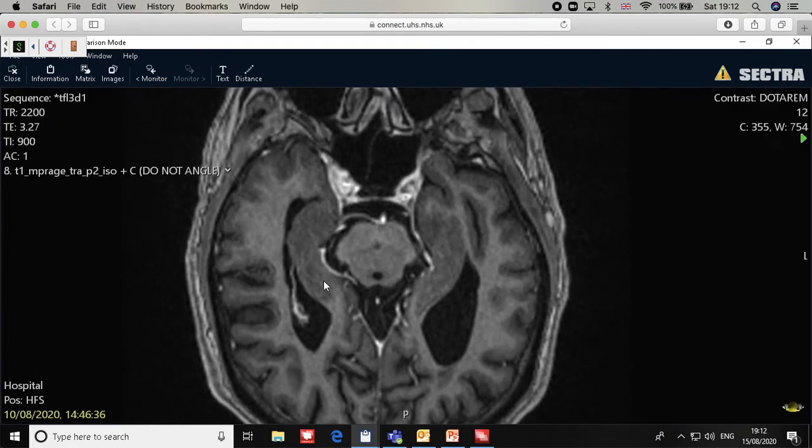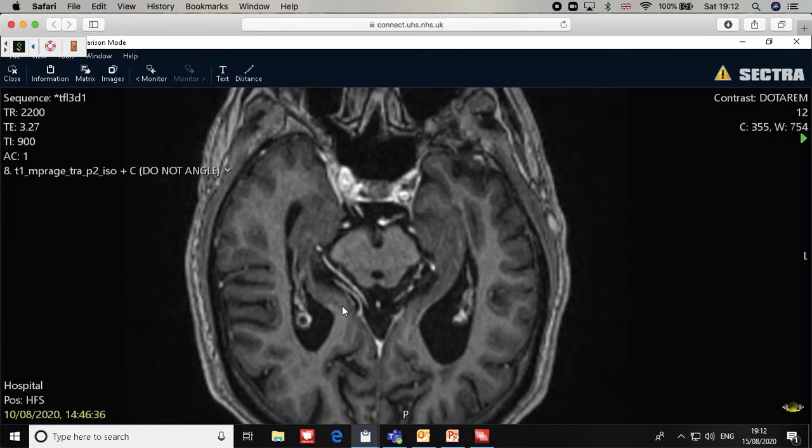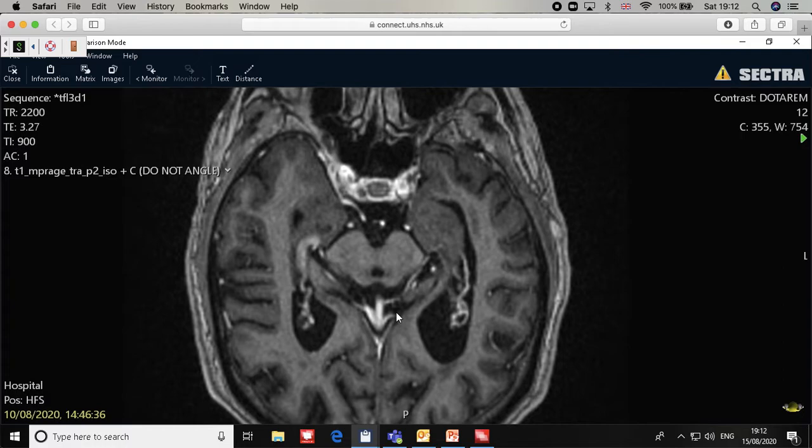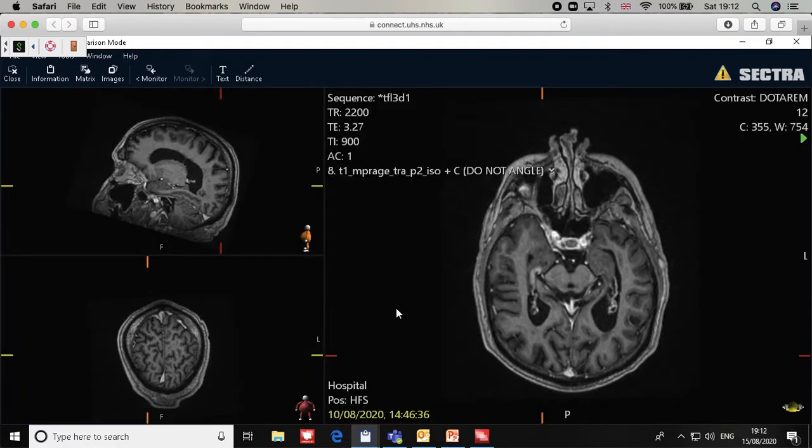I hope this is not difficult. You can see it here. This is the tail. I don't know why it's so slow like that. Sorry for that. I think what I can do is cancel the M mode. Just a second. Maybe that's why. So how can we cancel the M mode?